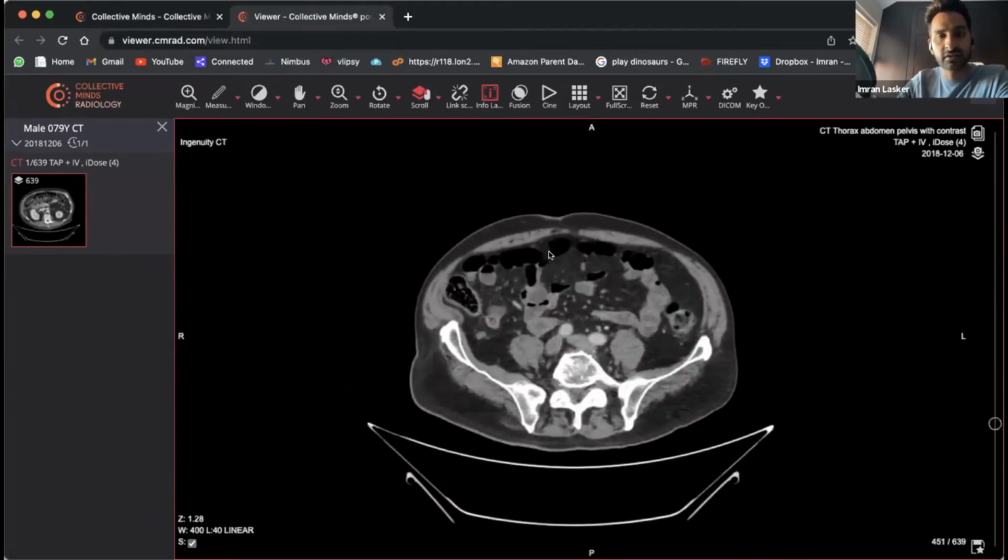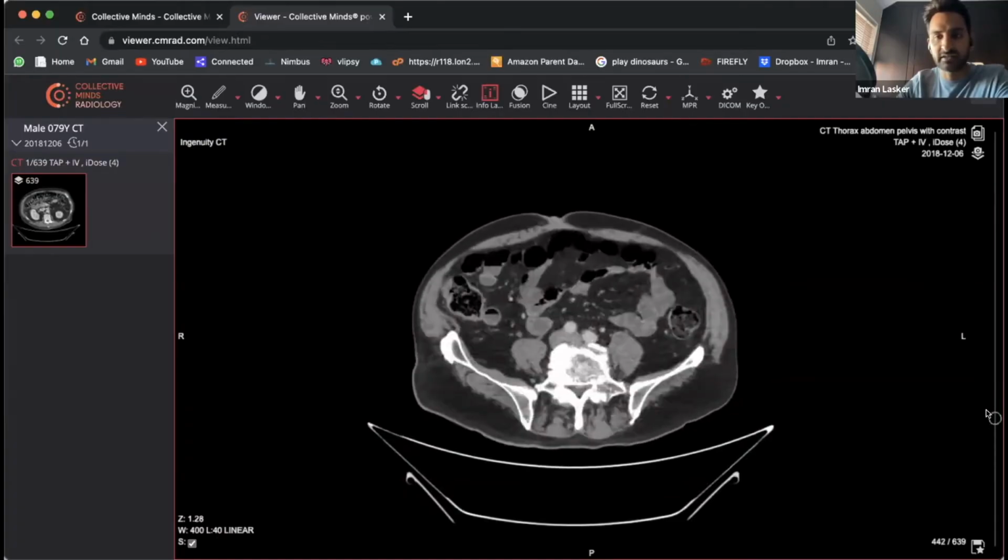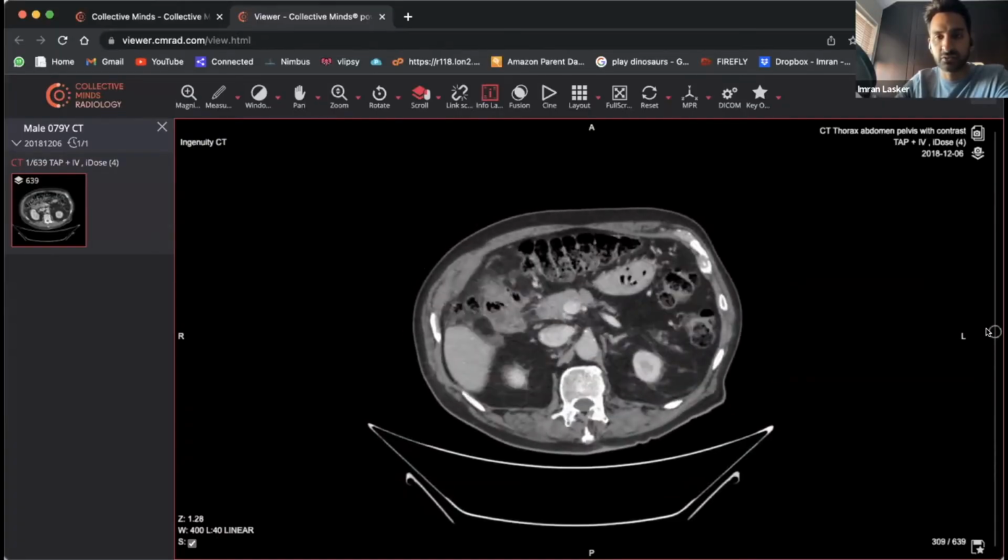And then you have an overall look at the small bowel, and there doesn't look like there's very much going on there at all. So have we finished? I mean, we could say that we're done now. What else do we really need to do?